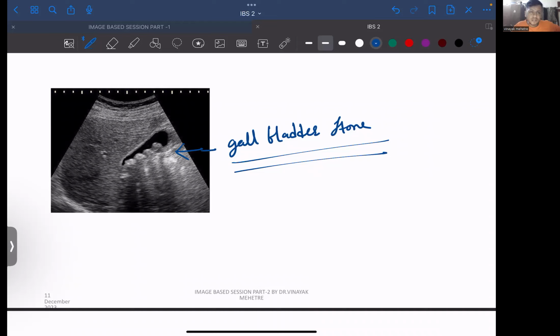Cholelithiasis था, now patient is presented with acute cholecystitis. गॉल ब्लैडर स्टोन पहले प्रेजेंट होते हैं, उस पे इन्फेक्शन चढ़ता है, उसी को हम बोलते हैं एक्यूट कोलेसिस्टाइटिस. TLC इंक्रीज हो गया इसके साथ, दैट मींस पेशेंट इज विथ इन्फेक्शन, इसके ऊपर इन्फेक्शन चढ़ गया.